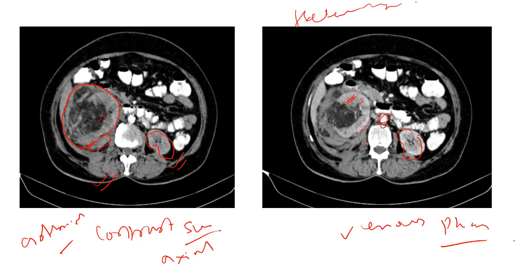So on the venous phase we are able to see the bowels, the vertebra, and the mass is heterogeneously enhancing with fat components here, and some solid components are taking contrast as well. So till now we get to know that we have a mass on USG which consists mostly of fat and vascular component arising from our right kidney.